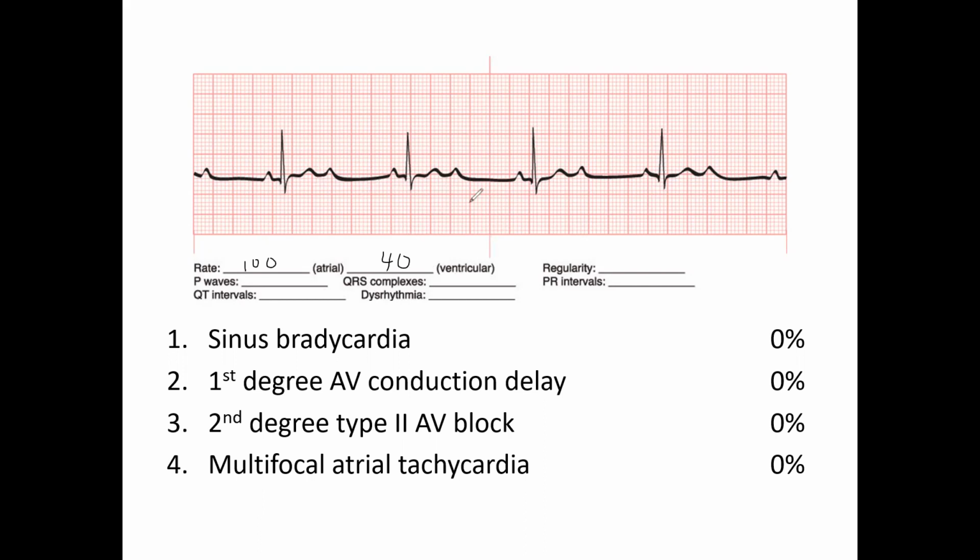Are things occurring regularly? It does appear to be regularly irregular, in that we have QRS complex, P wave, nothing after, QRS complex, P wave, nothing after, QRS complex, P wave, nothing after, QRS complex, P wave, nothing after.